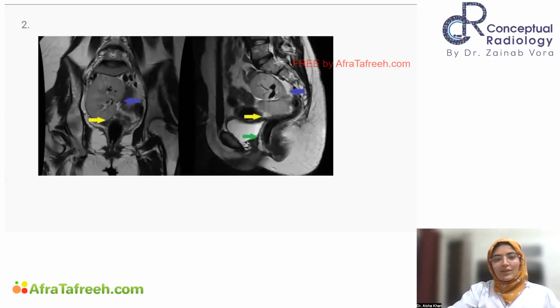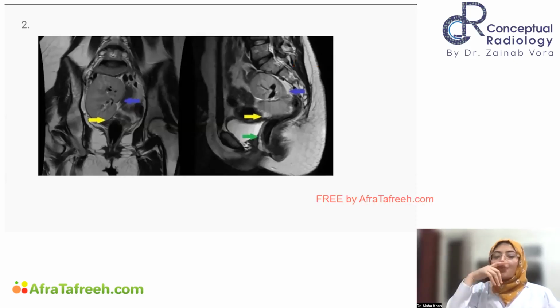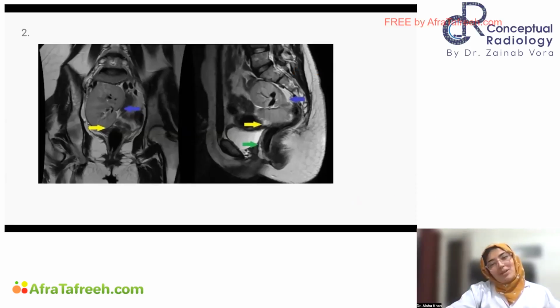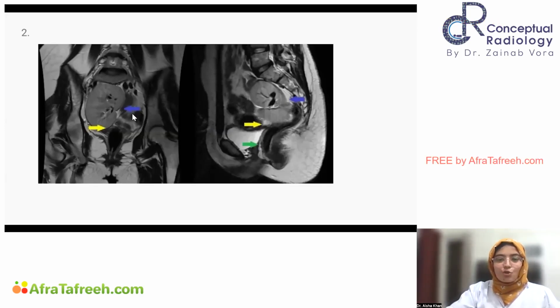Any guesses? What can this be? You can look at a pelvic kidney. There is an associated renal anomaly. And we actually do not appreciate anything like a normal uterus over here. Absolutely correct, Dr. Madhvi. This is MRKH syndrome with a pelvic kidney. We do not see any uterus there. All this is your vagina. There is a long atretic vagina. There is no uterus and other components like a cervix. There is a pelvic kidney.